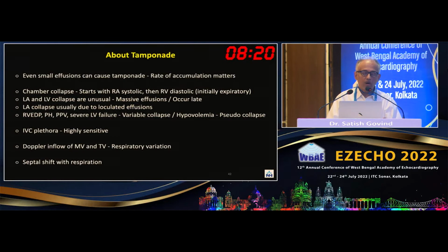And tamponade, how do we identify this? Remember that even small effusions can cause tamponade. It is the rate of accumulation that matters, not the amount. And the basic approach is to look at the chamber collapse.